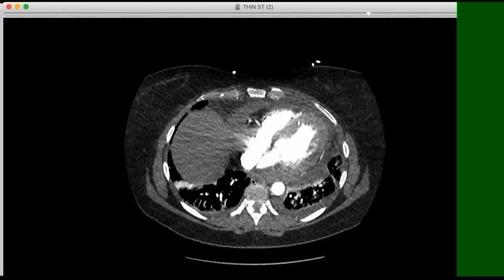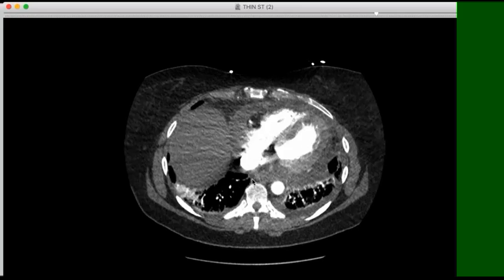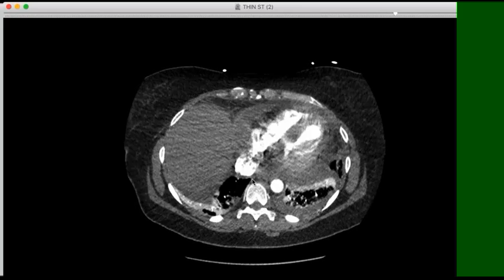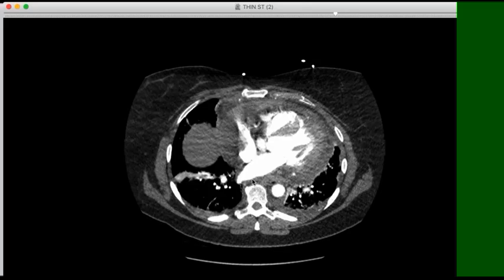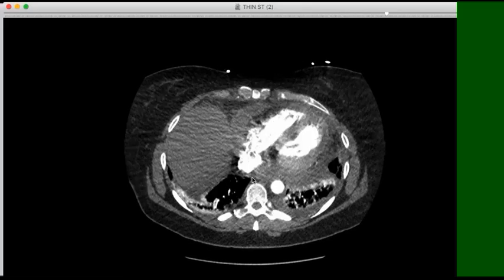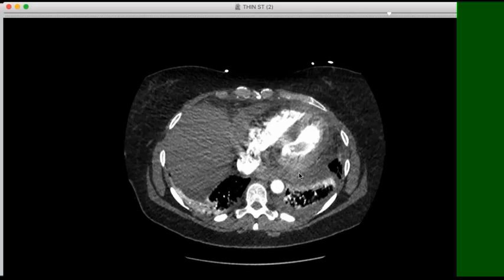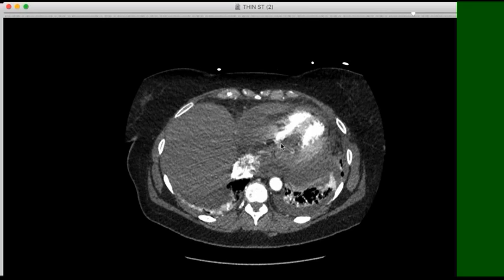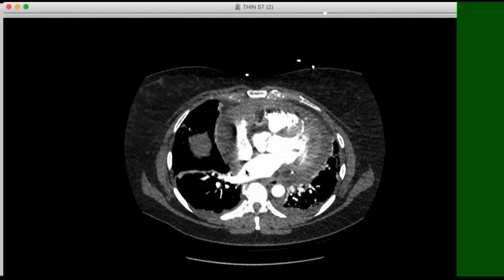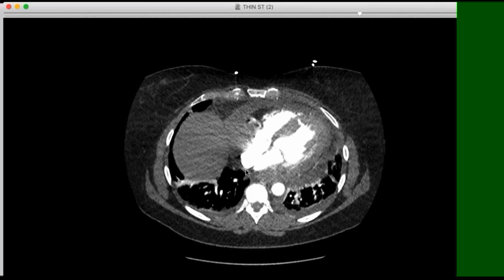And this patient had sort of a viral prodrome, and they tapped this effusion, and it had lymphocytes and stuff in it. And so this was a viral pericarditis that responded to conservative therapy. Developed some pleural effusions, probably because there's a little bit of left heart dysfunction because of this pericardial effusion. It wasn't frank tamponade, but you can see the IVC is large, and the SVC is pretty big, and the ventricles aren't particularly filling that well. So maybe early tamponade. So that was one case.